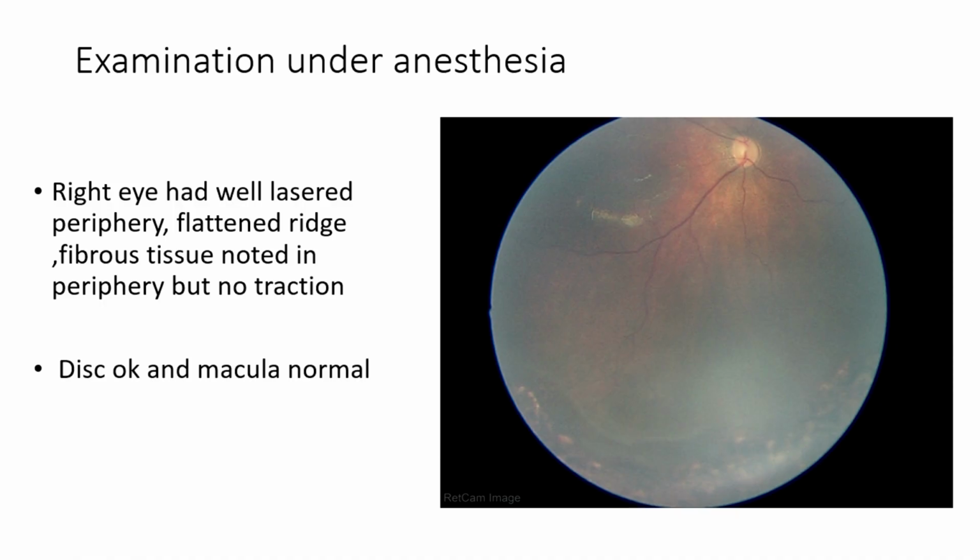No, it's a 3-dimensional structure. You are seeing something which is 3-dimensional. Don't assume that ridge is just a flat line. So are there two rows of ridge? It's not 2 rows of ridge. The ridge has got a 3-dimensional structure. You're just seeing 2 parts of it, planes of it. In between, you're not seeing something, but there must be a bridge of tissue there. It's not reflective. Yeah, next.